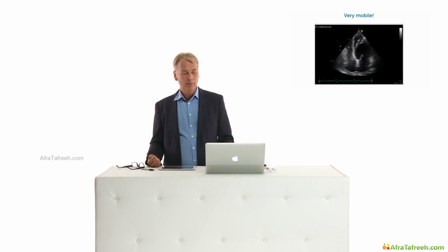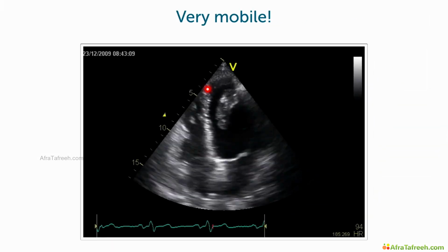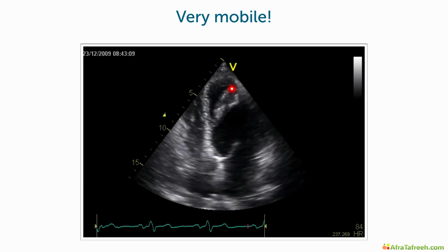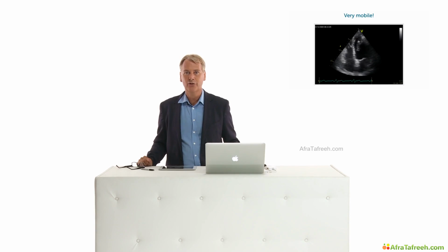This is a very mobile thrombus. You can almost appreciate that part of it has actually dislodged here from the interventricular septum. This was kind of stuck probably in here, and now it kind of is starting to release itself. Very scary echo, I would say.